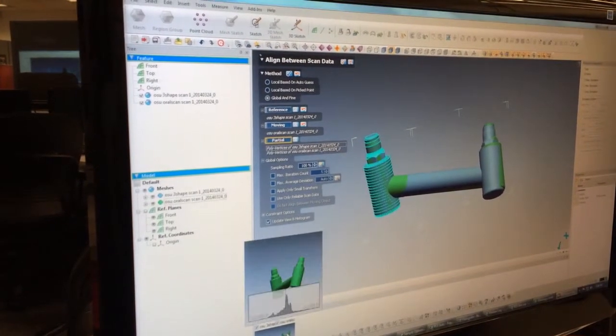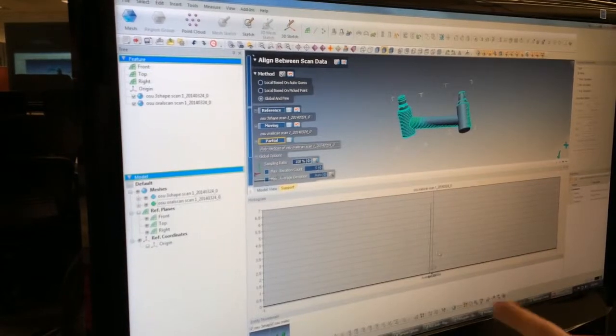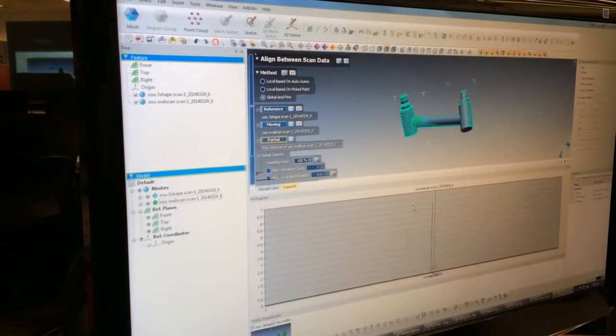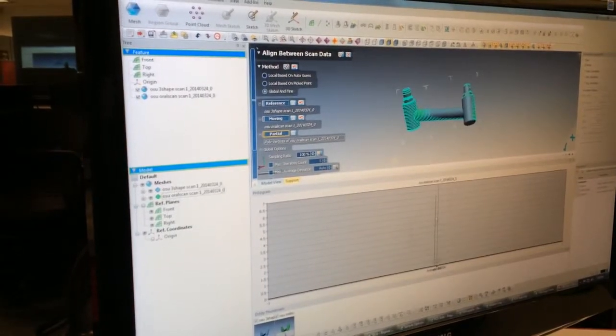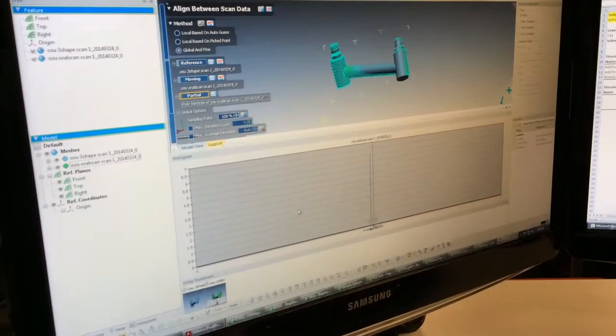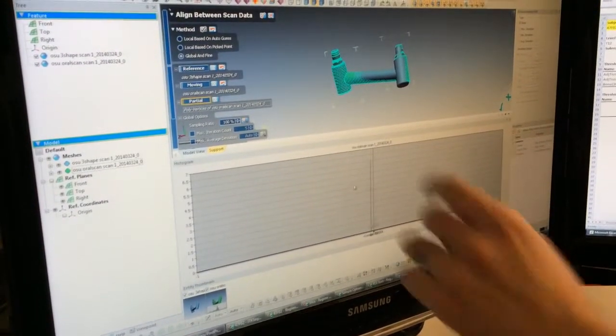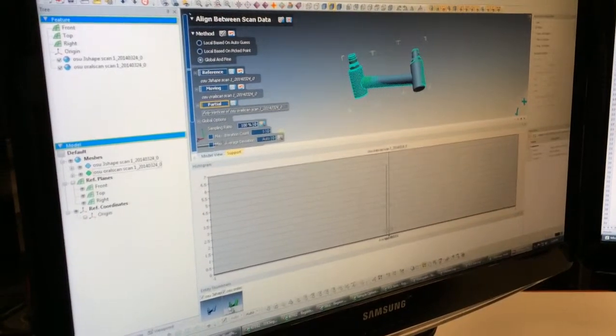And again, if you click on here, it shows just how awesome this alignment is. The histogram is basically a vertical line, so it aligned very closely. I'm guessing it's showing mainly the partial data that we picked. That's why it's so perfect, because it isn't perfect all over. It's perfect in that one spot.